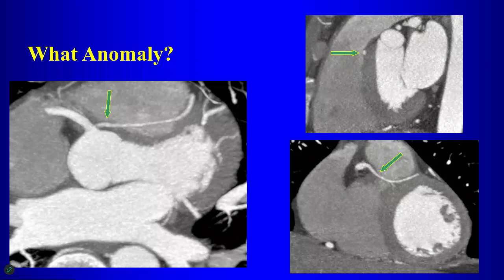It's not interarterial, right? So if we, again, look at this sagittal reconstruction, what am I pointing to here? What is this guy? Aortic valve, that's the aortic valve. This guy over here, pulmonary artery. The vessel is down here, right? So it's going through the interventricular septum. So this is called a transeptal course, right?